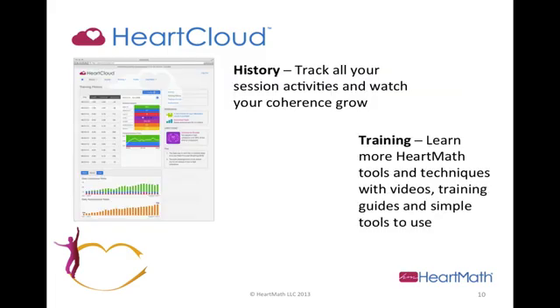You can get a fine-tuned view of your history, and also we are providing more training videos for advanced trainings and techniques on the Heart Cloud service, and there will be more forthcoming in the future.